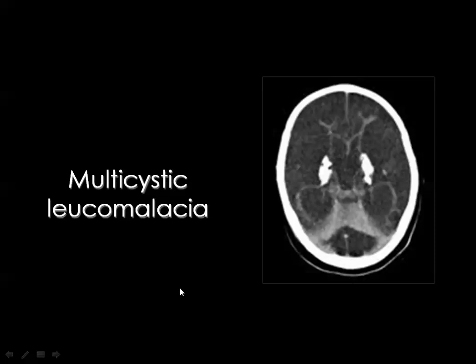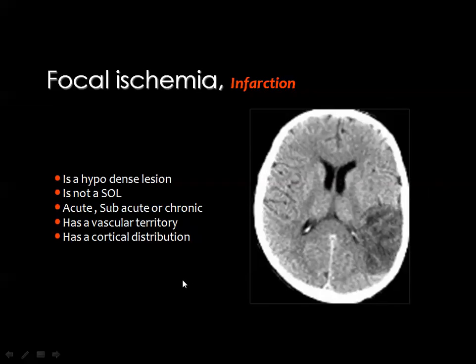The end stage of hypoxic ischemic encephalopathy is the appearance of a totally damaged, destroyed brain parenchyma, which is the seat of multiple cystic areas of encephalomalacia with dilated ventricles to compensate for the loss of volume of the ischemic tissue, and there may be foci or areas of calcification within the dead brain tissue.